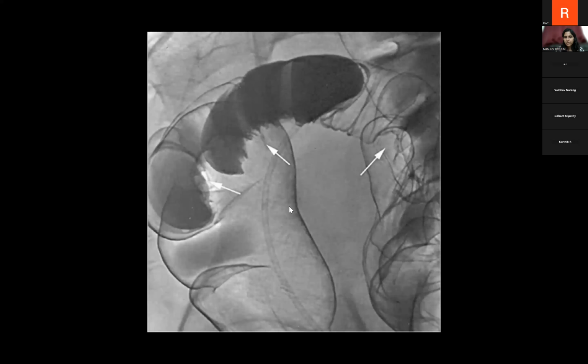It is not ischemic colitis, because in ischemic colitis the pathology per se will be in the bowel wall and it won't be something from the outside. But here, by the way it is involving, we can make out that the pathology is outside the bowel and not within the bowel wall. Yeah, it can be any other mass lesion also. Here we are considering endometriosis as a differential diagnosis. Okay, let's go to the next one.